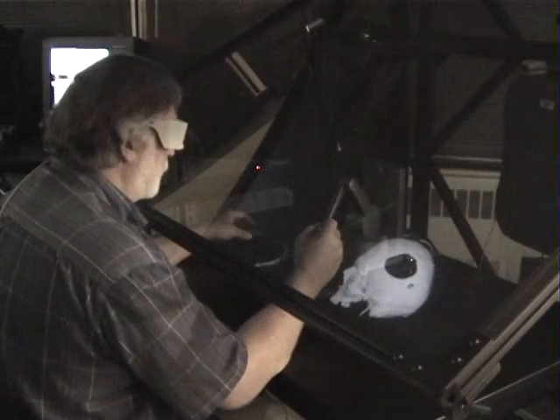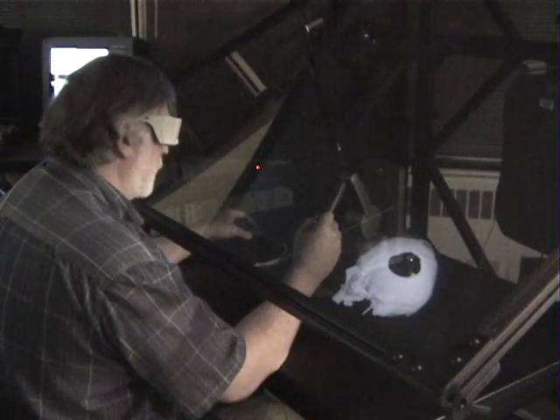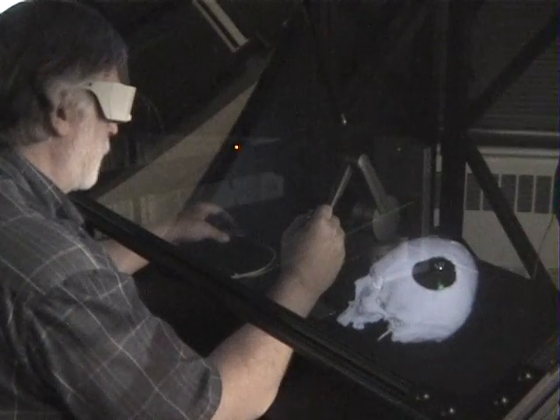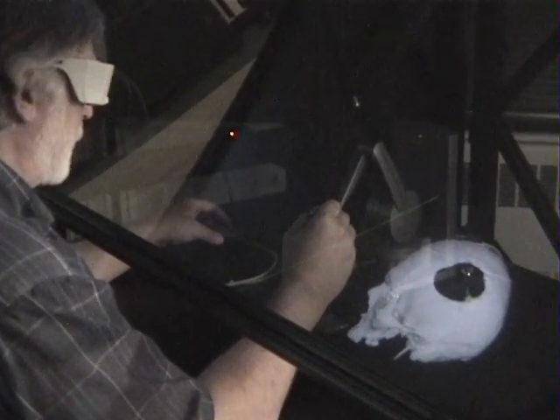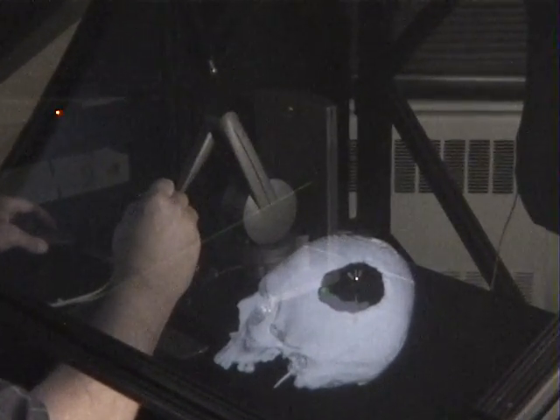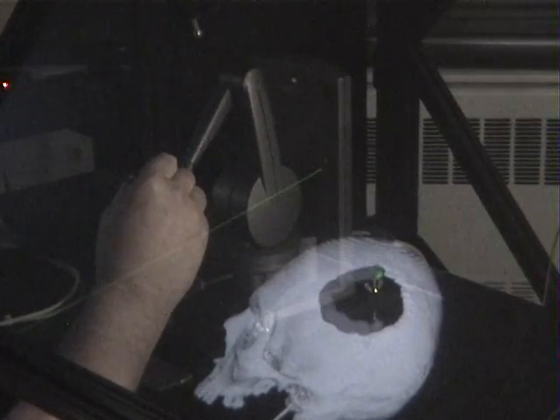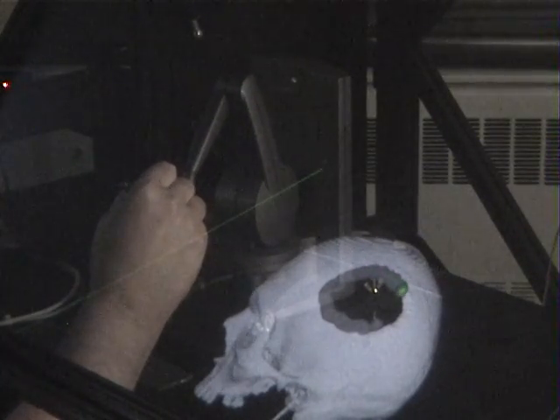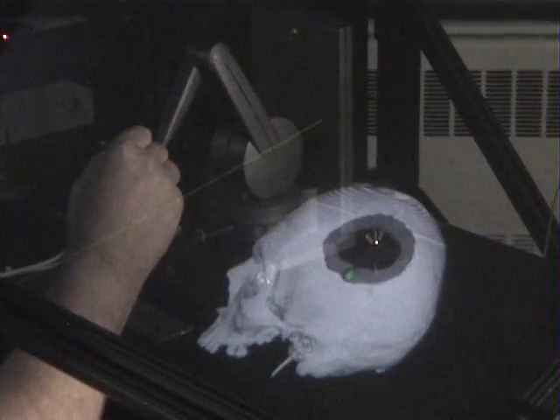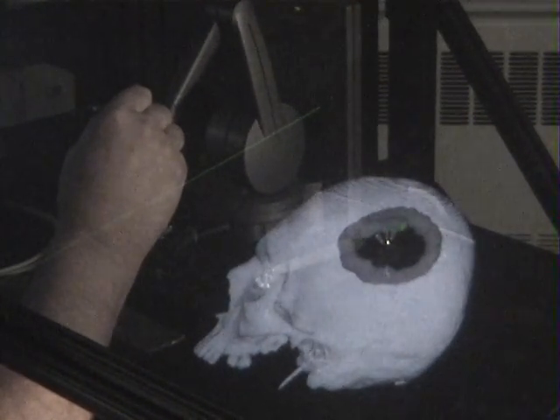Okay, the first tool I have is the one that's referred to as the add clay tool, and it's essentially the same as squirting toothpaste from a toothbrush. I can add volume to the edges of the defect simply by pressing a button on the side of the stylus and moving along the cut edge, trying to maintain the three-dimensional contour of the clay at the same time.